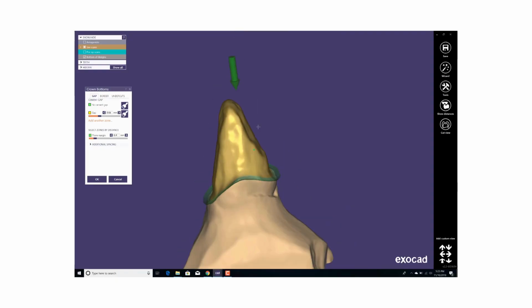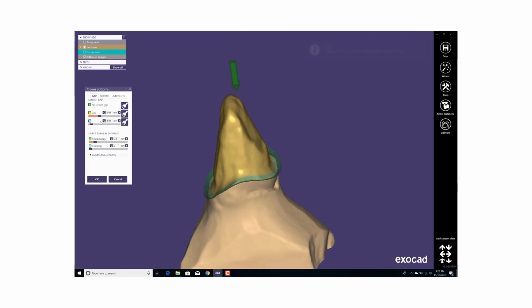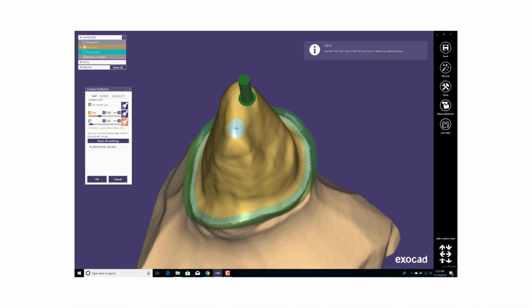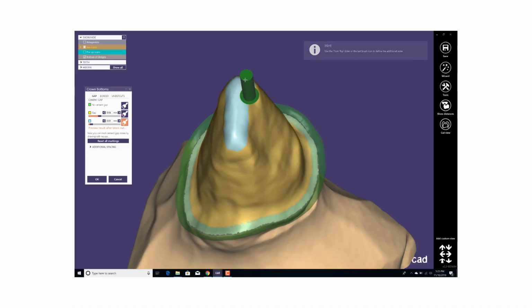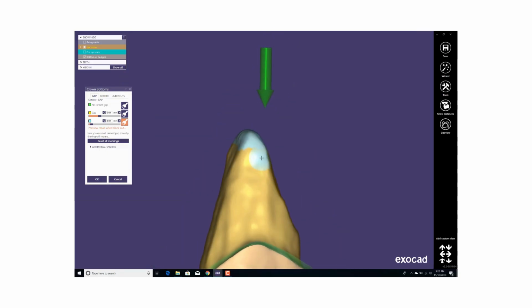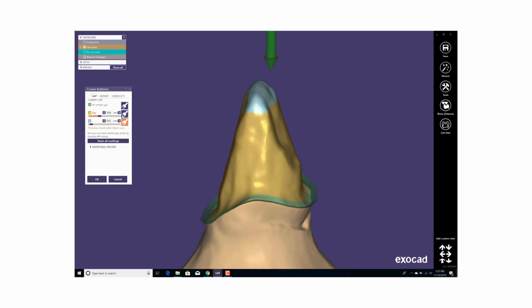Here I would suggest you add another zone, alright? By clicking here, I can paint the area where I want to add additional space. So I would just paint this area and I will have more space. As you can see here, I have more space right now at 0.01, at 0.04 plus at 0.01. So it's going to be a total of 0.05.